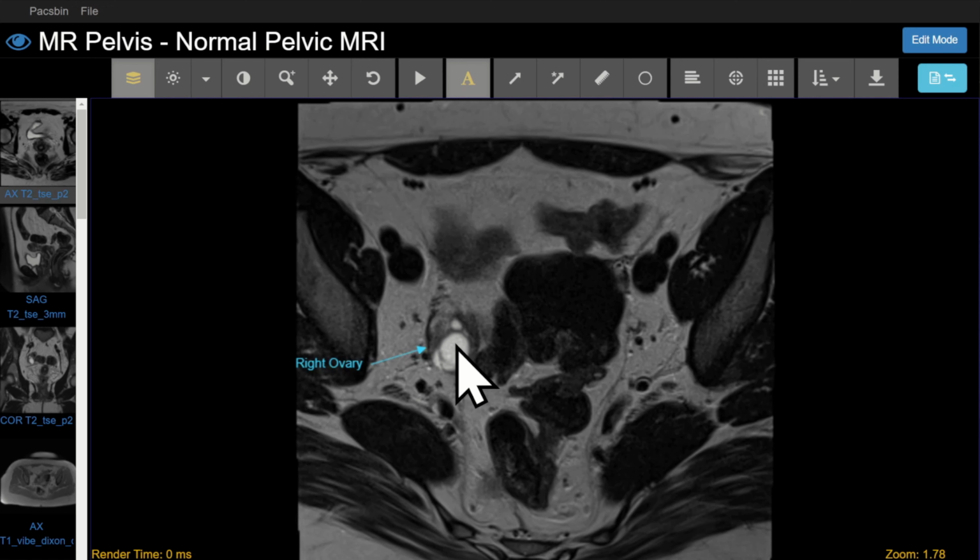That's why if you see a simple cystic lesion in a premenopausal patient in the ovary that is less than 5 centimeters, it's considered normal. By simple, I mean it's fluid signal, thin-walled, and there are no enhancing solid components or septations. Dominant follicles can have a cumulus oophoris due to cells around a developing oocyte. This is not to be confused with a septation.